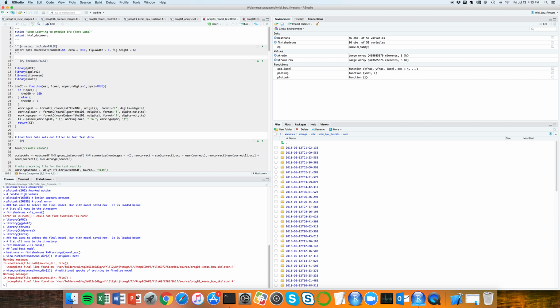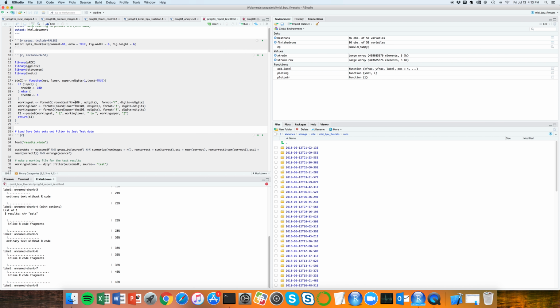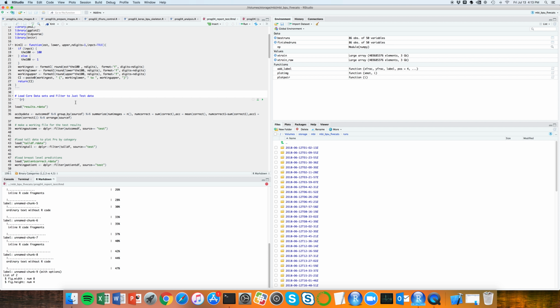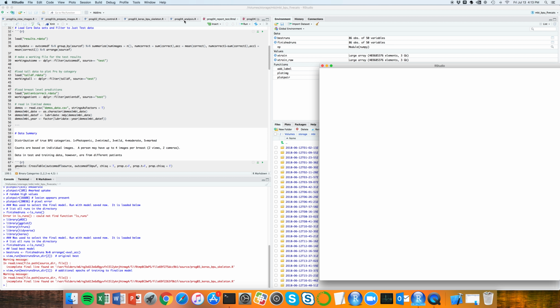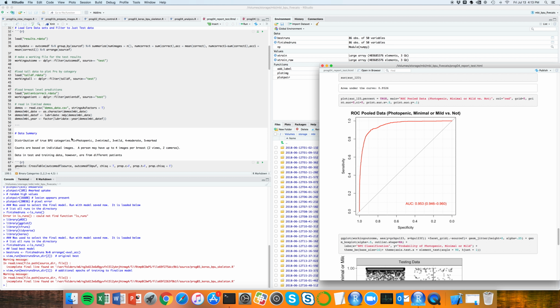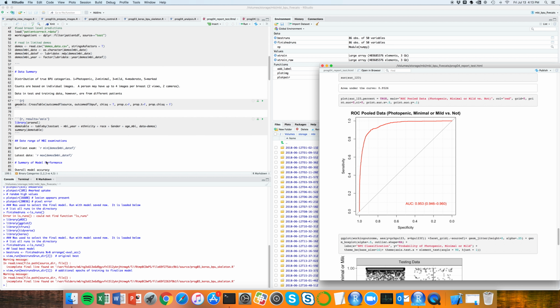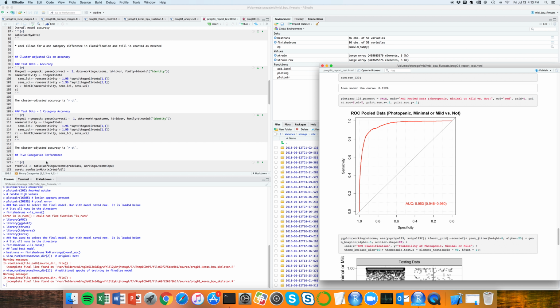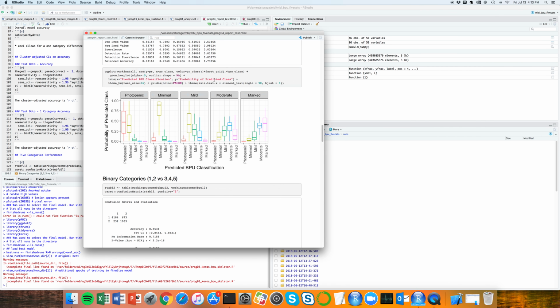I'm generating a report here, a markdown object. I use what I like to call object-oriented markdown. I try to keep within my markdown object minimal data processing, data derivations. I put all that within the analysis program. And then what I'm largely doing is doing simple calls and reports based on defined objects. So in doing so, it keeps my markdown very clean, and results come out.